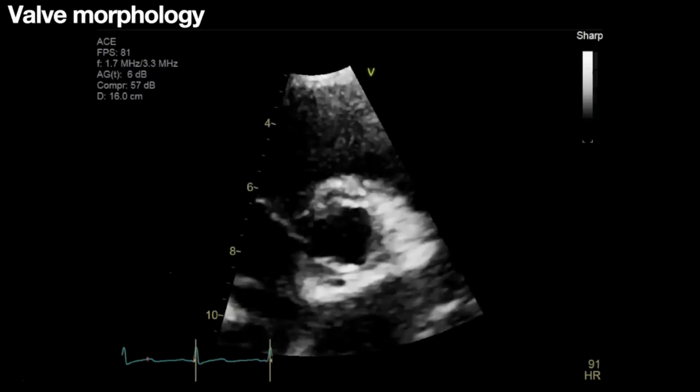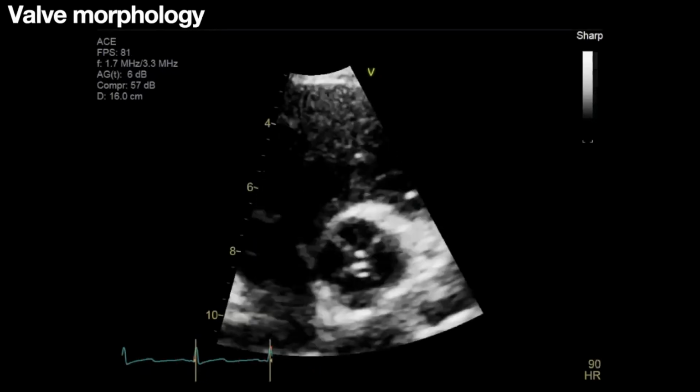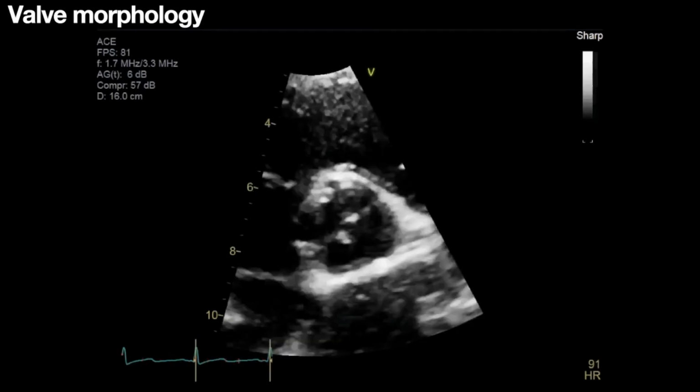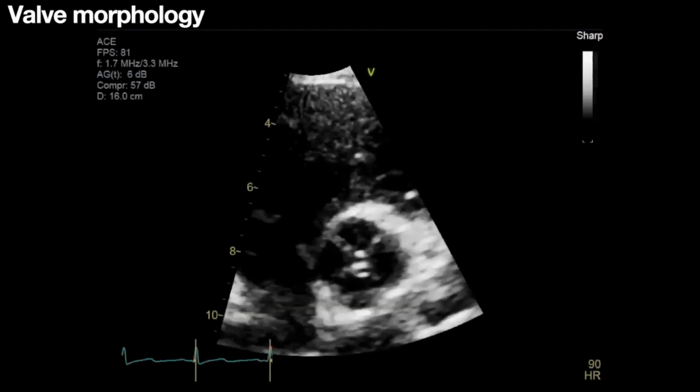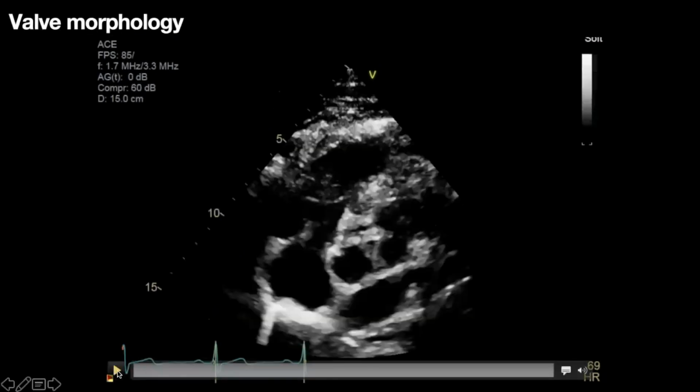Yeah, so this is a beautiful quadricuspid valve that came through the lab with some calcification of the leaflet tip. I think it's an interesting side point. Just seeing the sinuses of Valsalva on the previous aortic valve kind of gives you the idea that it didn't start off as a unicuspid valve. You know what I mean?